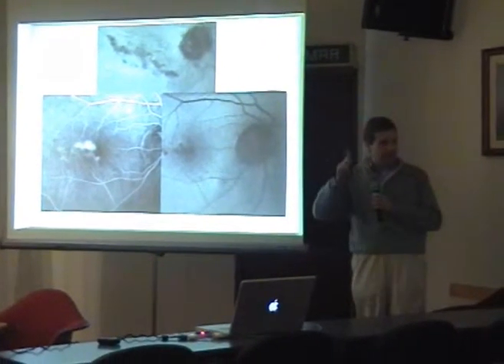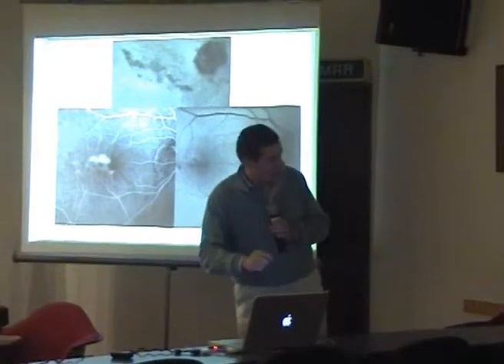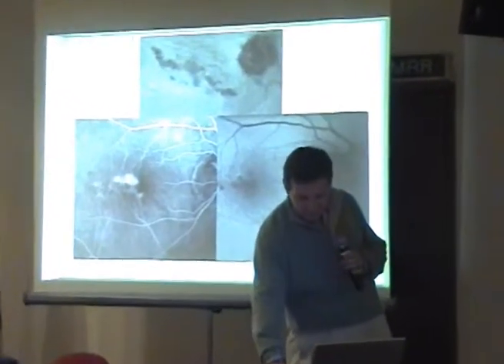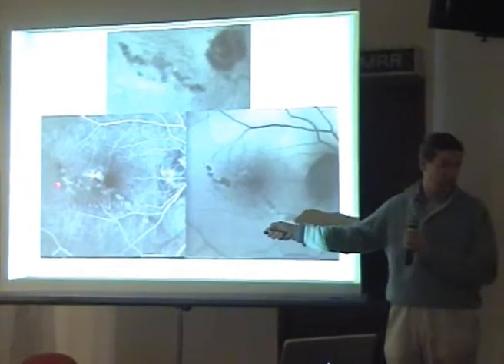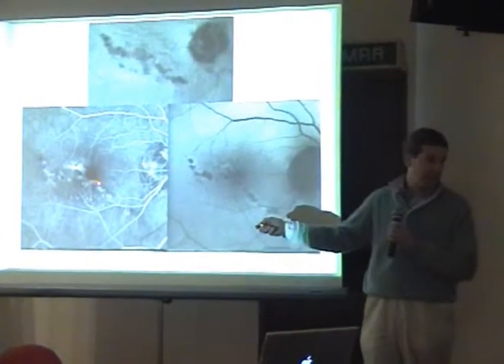Now, we look when she came back complaining of some scotoma. The lesion, you see, it's fantastic, completely closed. No edema in the central area.